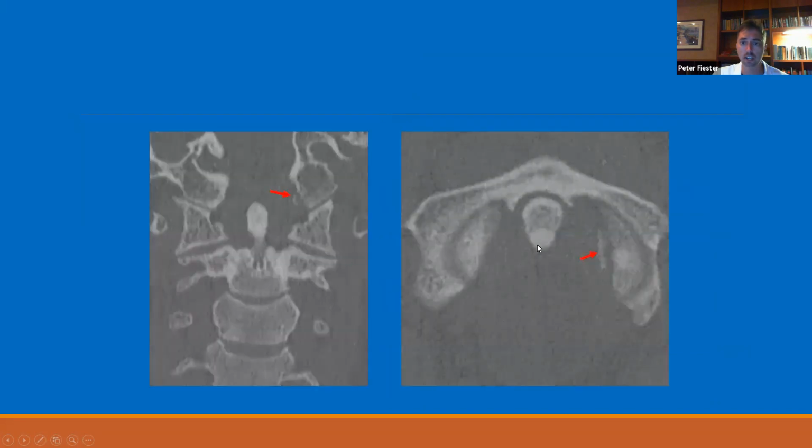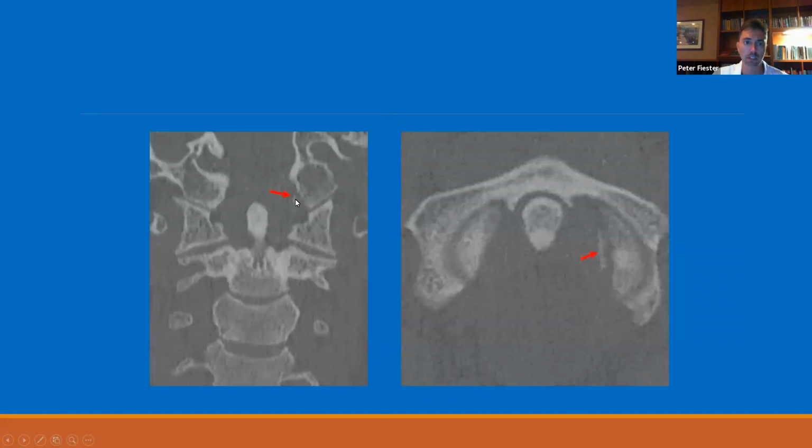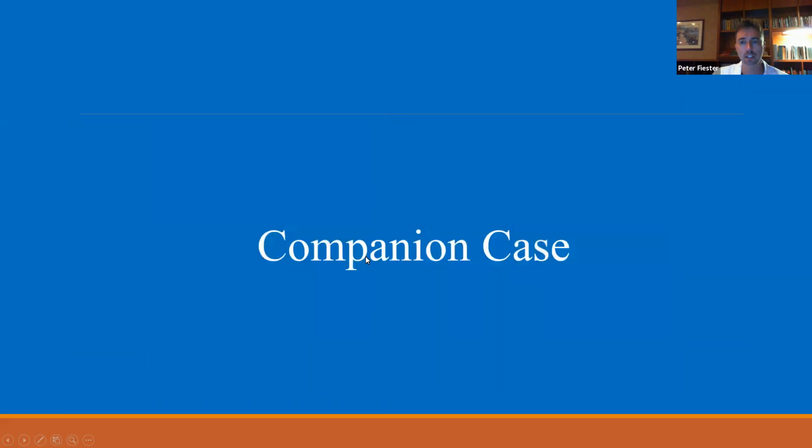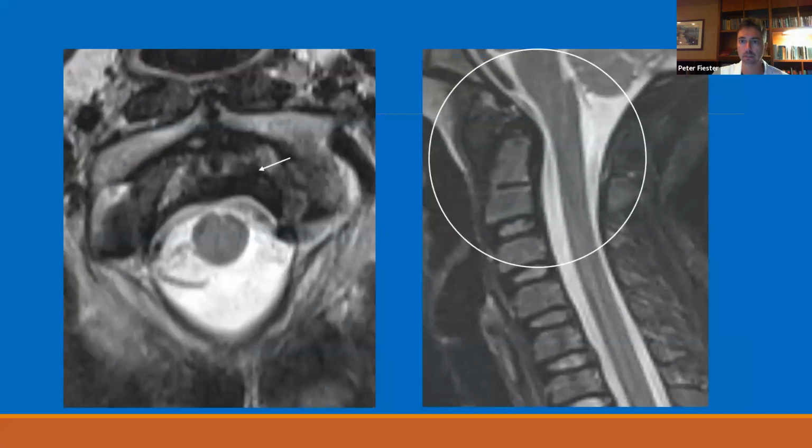And this is just another case, again bad image quality, but the MRI is always very underwhelming. So I think it's kind of cute to demonstrate: if there are no other fractures or joint space widening or anything else crazy on the CT scan, these are isolated little avulsion fractures. You probably don't even need to get an MRI. I don't know what you guys think in terms of treatment algorithms, but these typically are isolated, and the MRIs are typically negative for a lot of these condylar avulsions. I don't know if that's your experience.